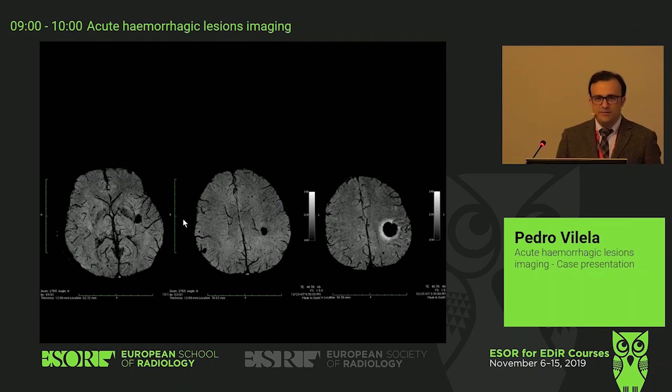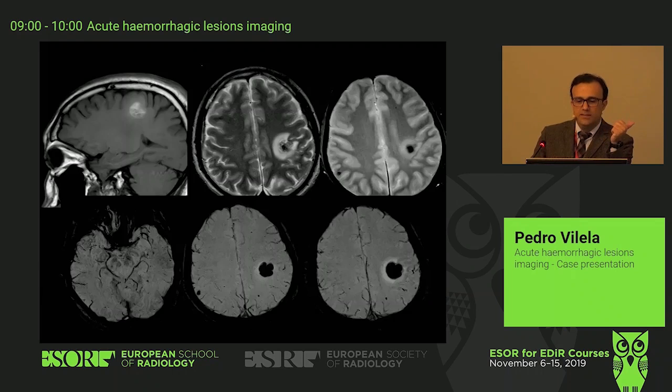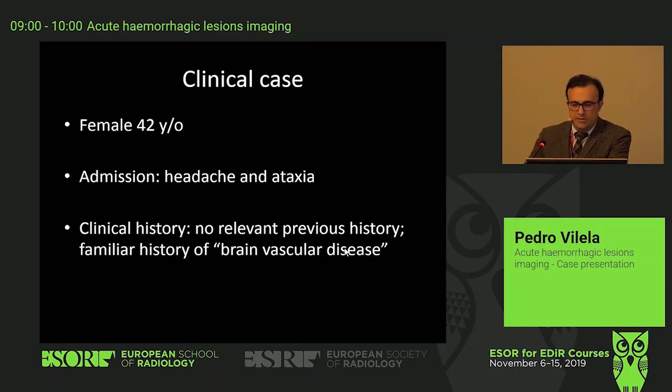Okay, vasculitis. Things that give you this type of pictures. Could be diffuse axonal injury, which is not the case, because this is not diffuse axonal injury. Metastasis with microbleeding metastasis. Could be. More. Multiple cavernomas. Okay? Young patient, multiple lesions, and actually this was the case with multiple cavernomas. This patient was operated on this. Okay.